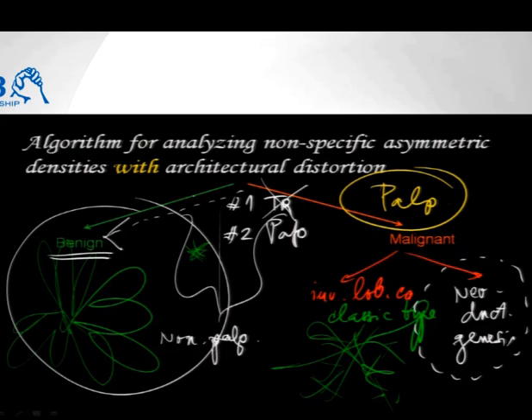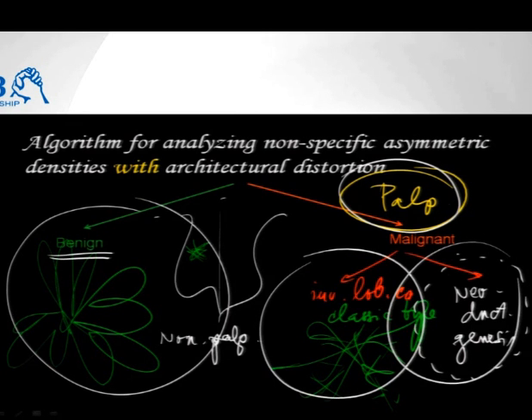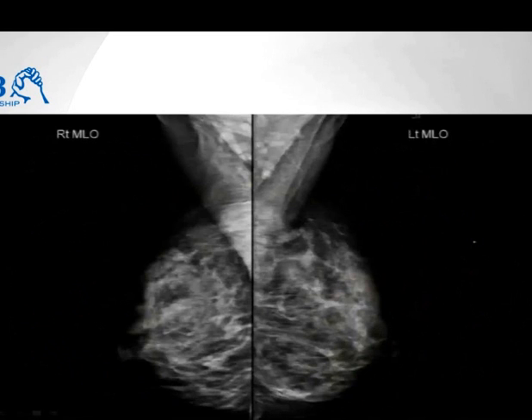However, if she has a huge breast, in the middle of the breast there is a non-palpable architectural distortion, it still may be carcinoma. However, what is important here is that, let's say she has a palpable lesion, and they usually call it thickening. Unfortunately, you really have to think about two very mean malignant subtypes, the neoductgenesis and the so-called classic invasive lobular carcinoma. Here it is in front of you. I'm sure you already found the architectural distortion. It's here.